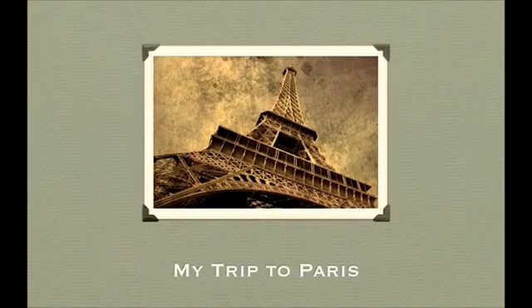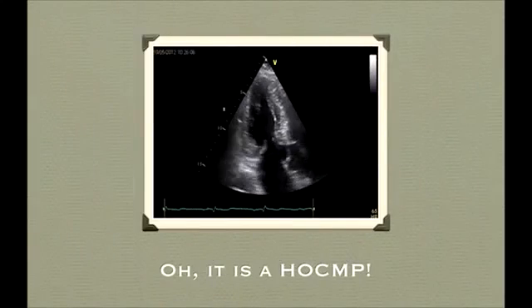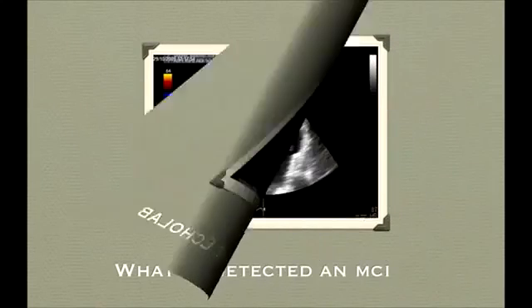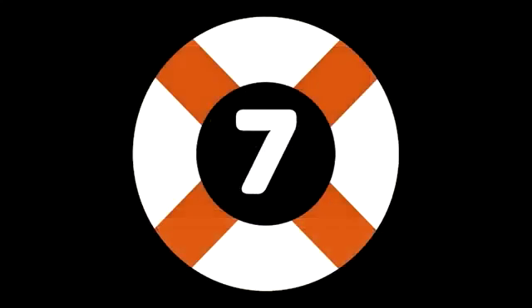Similar to the way you will recognize a pathology such as pulmonary hypertension, hypertrophic cardiomyopathy, tricuspid regurgitation, or an acute myocardial infarction. So are you ready? Ready for a countdown? We have 7 cases for you, and at the end, Franz is going to give you a very important message.